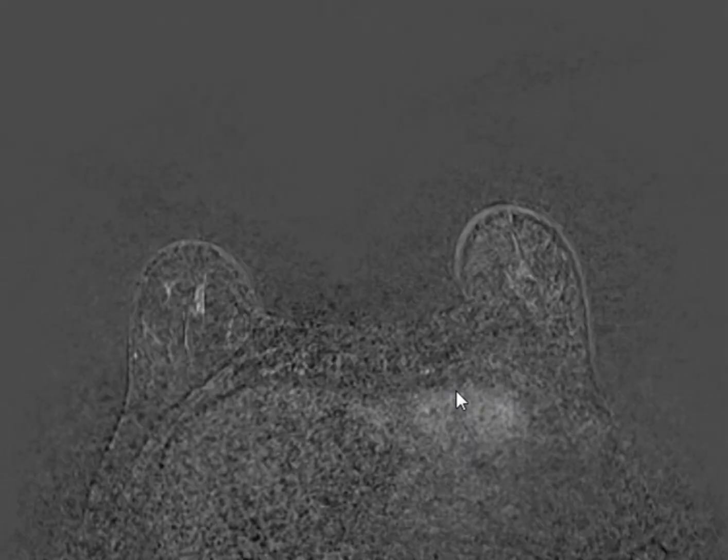So what do you see here? This is the first sequence after the contrast. Enhancement, I'm not sure. It looks patchy, non-mass-like. Yes. Let's see another sequence. No, this is not subtracted. Always choose the subtracted one. Yeah, this is the second post-contrast sequence.